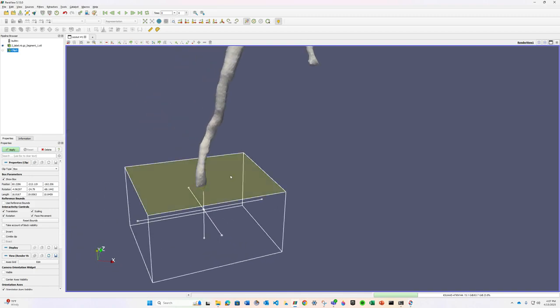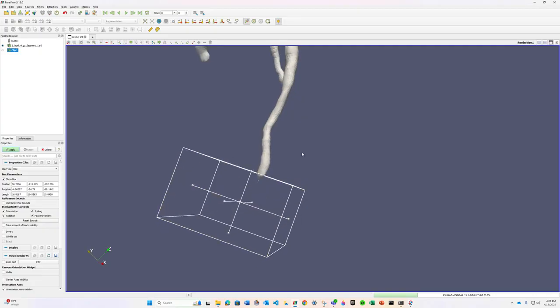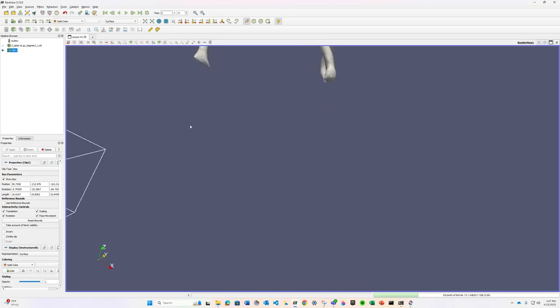Once you have it in position, click and hold the top to see where it's going to cut. The cut doesn't have to be perfect the first time, because you can always fix it. It's not like a clip is permanent. So once you hit clip, you'll see that.